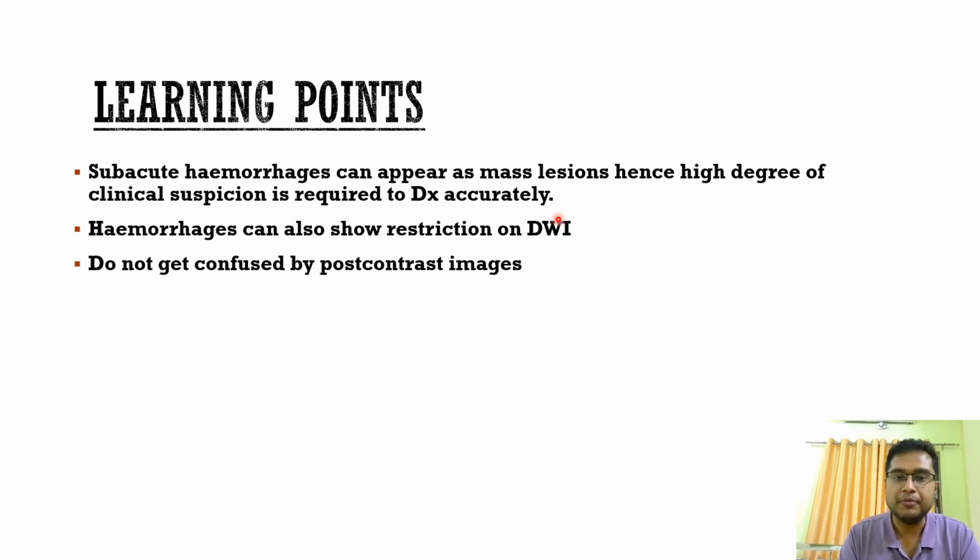some important information. I also did an MRS in this case, because I was thinking along the lines of a neoplasm as well, that there is some neoplasm that is having some hemorrhage within. And always advise a follow-up in this case, because if there is some neoplasm underlying, it can be detected.